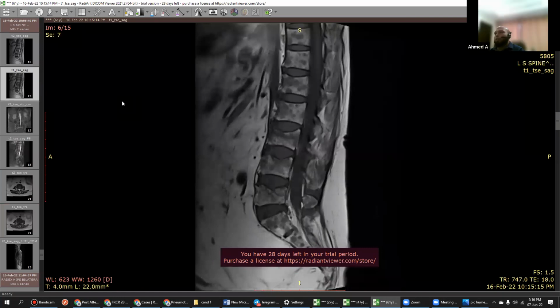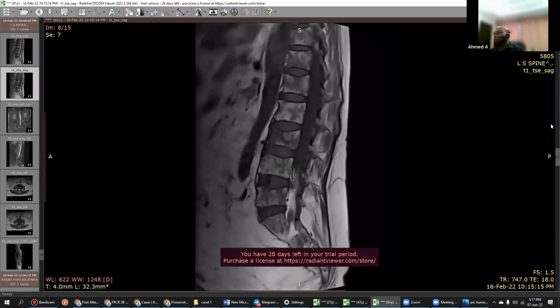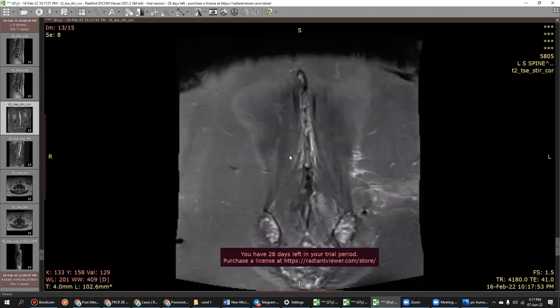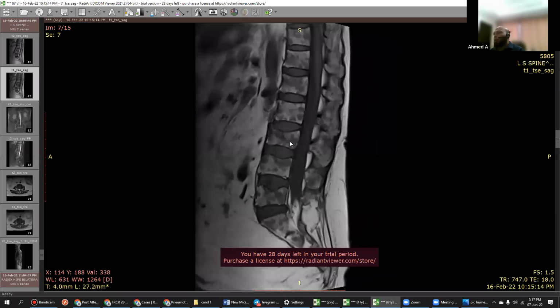This is diffuse. In T1, is there anything more you want to tell? Is MRI additionally helping you with something very important? Some loss in height in the vertebral body, and yes, these multiple small ones. Okay, you can click and show me. Here, and at the third level there is some loss. L3, right? Yes, you have to mention this.